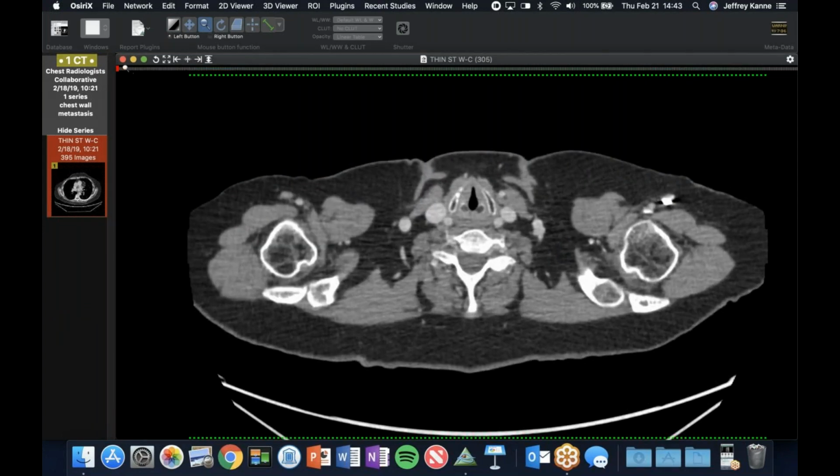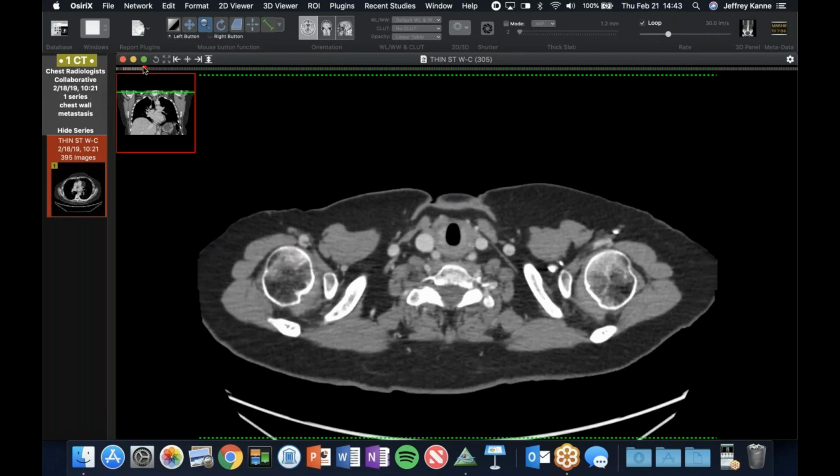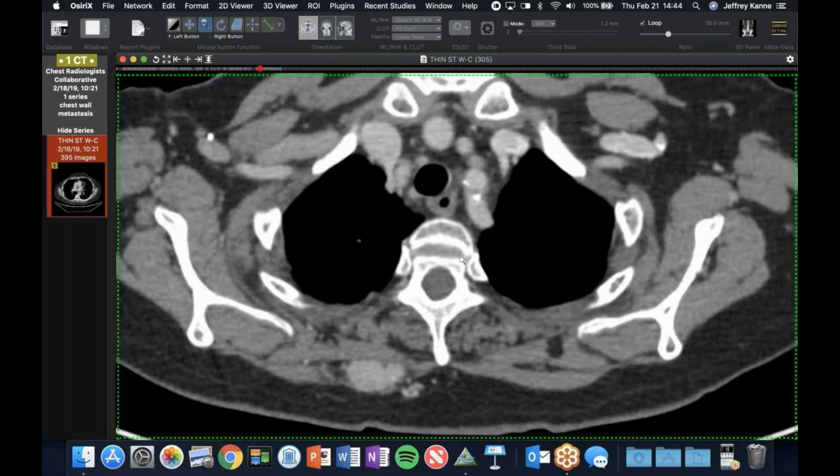All right. Okay, so this is a cool case. This is sort of a mini companion case to David's vascular tumor. This is a patient who has renal cell carcinoma that was treated some time ago. I want to say the nephrectomy was like 7 or 8 years ago, and had no metastases. And this was just a routine surveillance. And we picked up this little guy here.